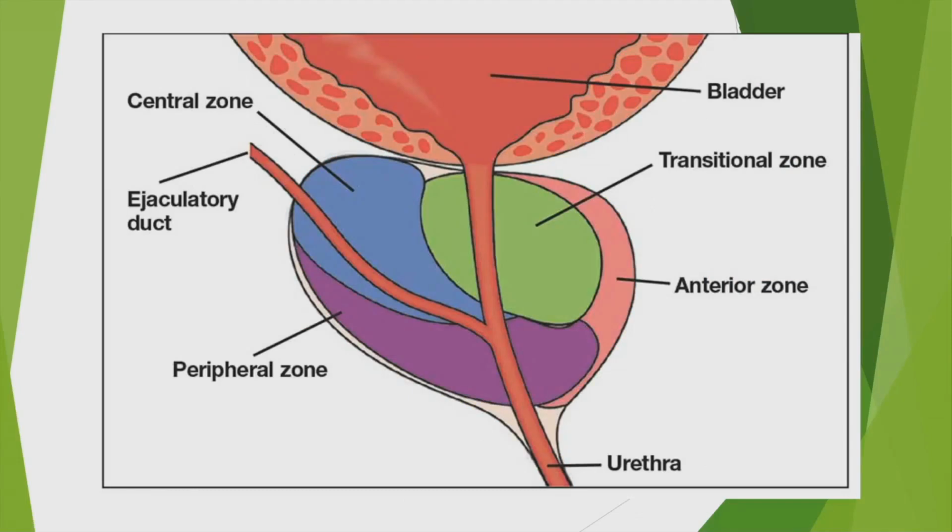So I told you no clinical cases. For a change of pace today, let's talk about echoanatomy of the prostate, because we're always hearing about central zones, transitional zones, anterior fibrous zones, and peripheral zones. And it's true that it's complicated. This is an anatomy diagram, so it's easy. But it's true that it's a bit tricky to get your bearings.